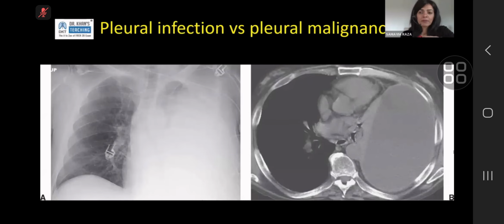Whereas if that bigger pleural effusion was caused by infection or inflammation, the patient is symptomatic. So that's one way of differentiating it. So that large pleural effusion here shows... this one I've put in just to show you the pleural thickening. Again, a very commonly underdiagnosed or overdiagnosed pathology is pleura. Pleura, again, the differential is infection versus malignancy.